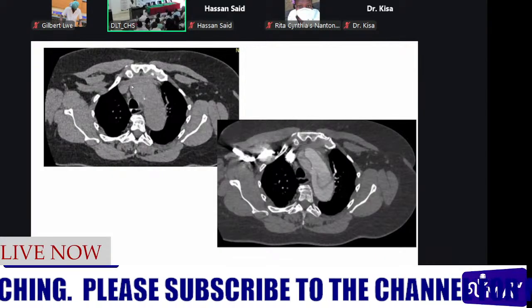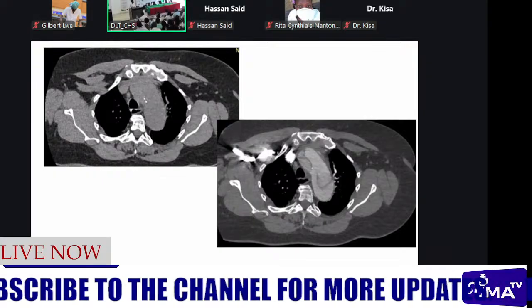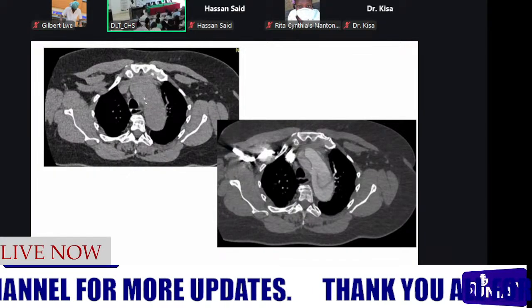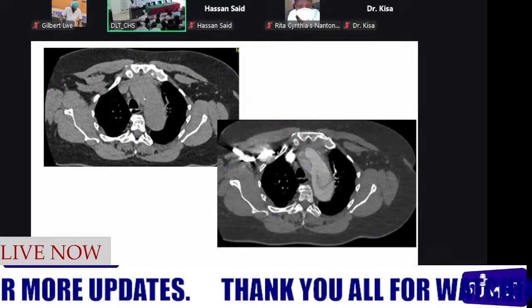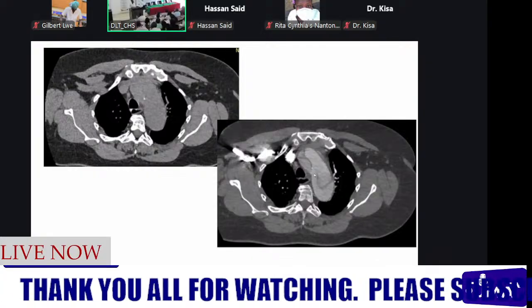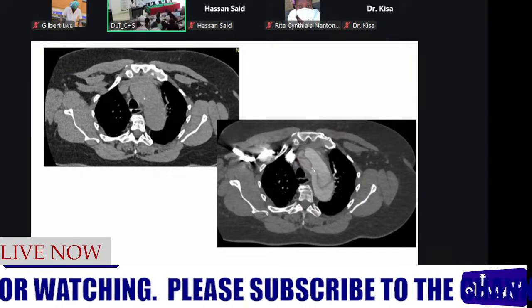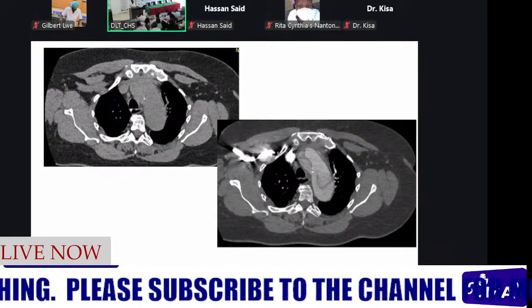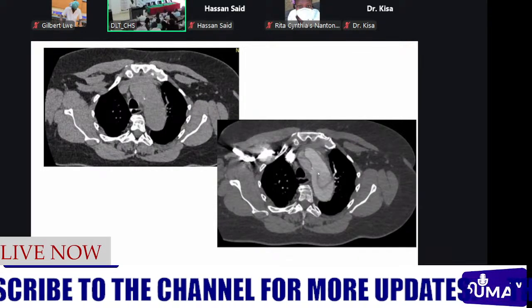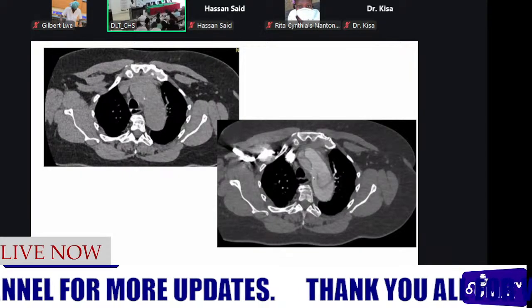For this patient at this level, the only thing we were able to pick up was this focal hyperdensity within the aortic lumen, and it was suggestive of an internally displaced intimal flap, intimal calcification. Then looking at the contrasted image, we are still at the level of the aortic arch. At the point where my cursor is, we can still appreciate the internally displaced intimal calcification. Then we are seeing the entry point, which was located at the aortic arch here.